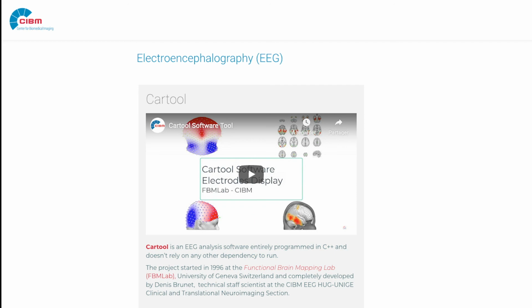I'm not sure. I haven't experimented, but I'm not sure it will really make a real difference between the gray matter and the surface of the white matter. We picked the gray matter because that's where the sources are supposed to be. But given the resolution of the final inverse solution, let's say approximately 1 centimeter, I think you will catch what is within a 1 centimeter cubic volume.